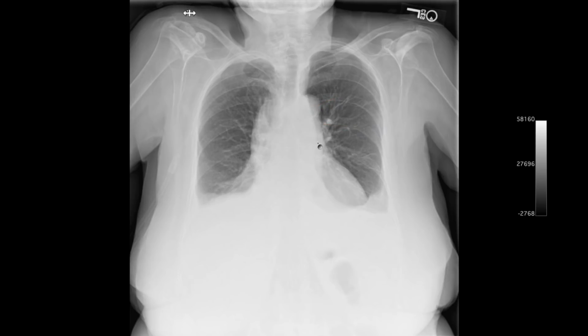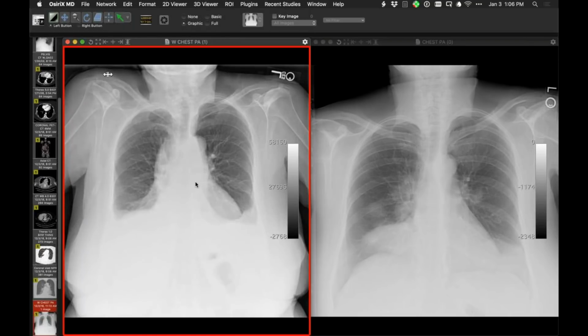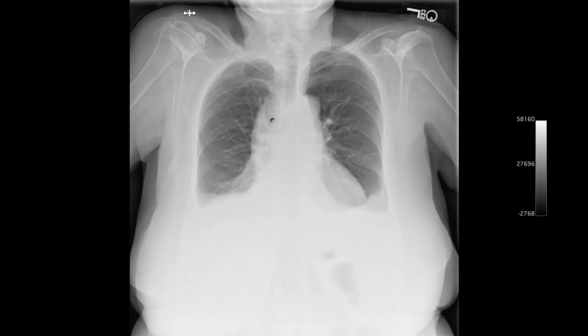There are also interfaces down here, and also in looking at the right side of the mediastinum, there's also abnormality there. So initially, when I looked at this, if I perceive this abnormal interface and it's new, I usually think of the so-called aortopulmonic pleural reflection.